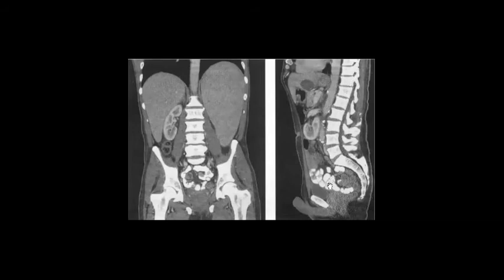He gives you a sagittal image. So the bone looks intact, it is not a bone window, but you can note something in the spine, what it could be. Increased density, perfect.